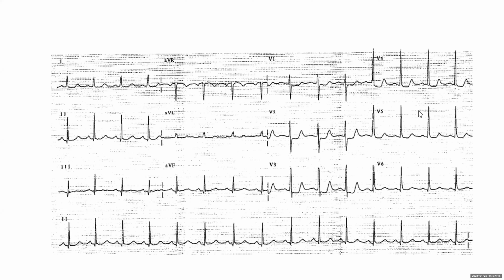Can you comment? So RVH, do you think there is RVH? Well, first, there were a couple comments about RVH. Why are you guys thinking about RVH, Hina? Yeah, no RVH, because posterior MI. Exactly.